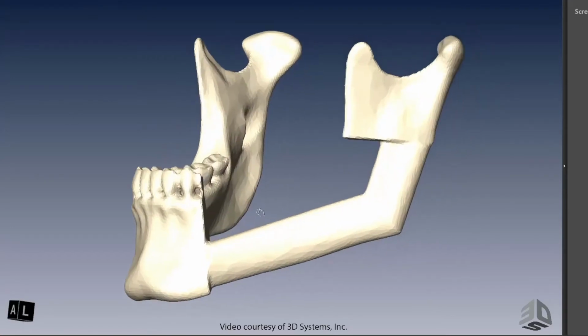This is with a 2.0 millimeter profile height custom plate. Those options that we currently have available are 2.0 and a 2.8. Is the 2.0 acceptable? It is, yep. I'm finding the 2.8 is quite thick actually, and if the resection does go down to the soft tissue subcutaneous, you're going to feel that plate. So 2.0 is perfect, thank you.